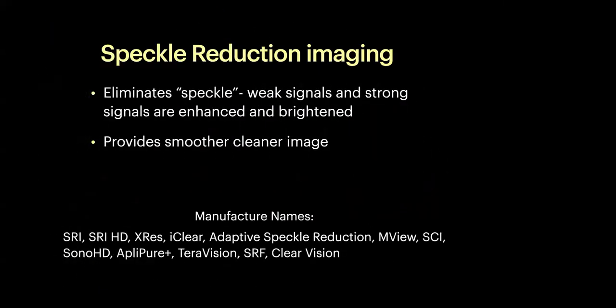So how about speckle reduction imaging? And I include the different manufacturer names here for those of you that utilize different ultrasound machines of what this may be called.